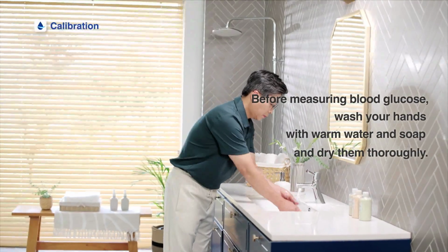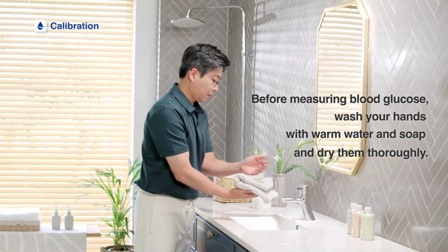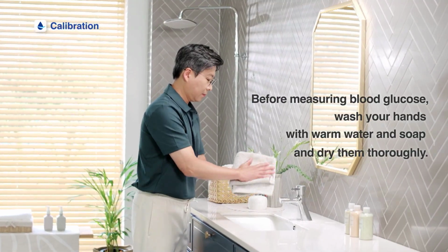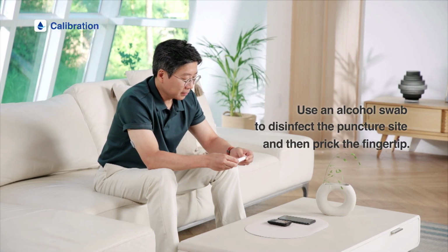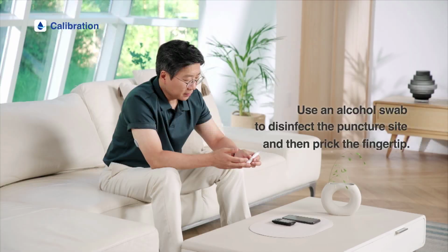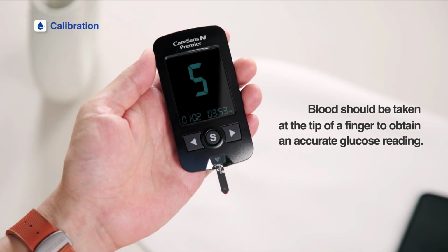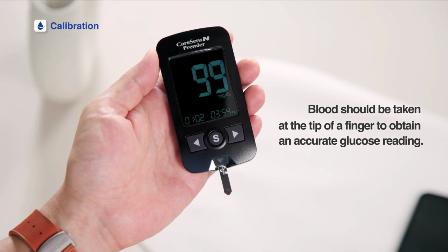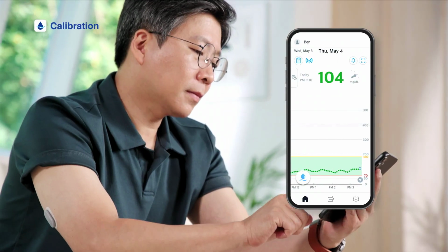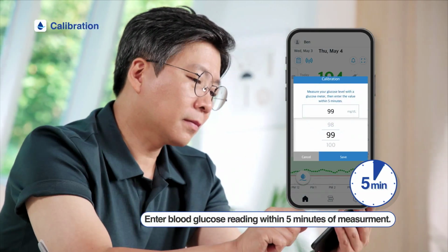Before measuring blood glucose, wash your hands with warm water and soap and dry them well. Do not apply lotion or moisturizer around the puncture site. Use an alcohol swab to disinfect the puncture site before pricking. Blood should be taken at the tip of a finger, otherwise, a glucose reading may not be precise. Enter the blood glucose reading measured within 5 minutes on the app.